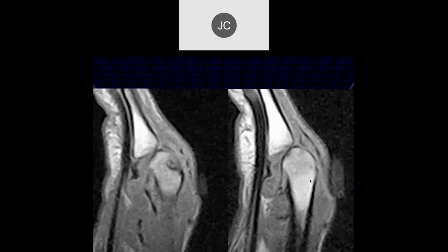Okay, Robert. All right, so here looks like there's a marker over the dorsal aspect of the second MCP. And looking at the MCP head, it looks like there's maybe an impaction injury dorsally. And then if you notice, the joint is not congruous. The articulating surface of the metacarpal head is not centered on the articular surface of the proximal phalanx.